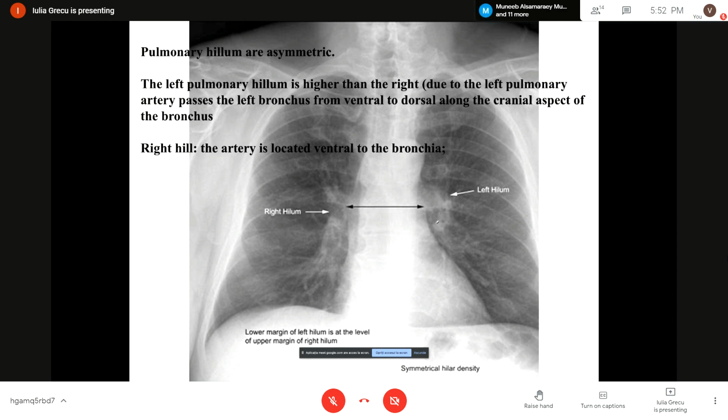After the region of the hilum, the arteries will divide further into smaller branches, which will form the markings of the interstitium of the lungs. These are band-like and discrete opacities that divide into further smaller branches that constitute the normal vascular markings of the lungs. The vascular markings are more prominent in the basal and inferior aspects of the lungs because of the gravity effect on them.